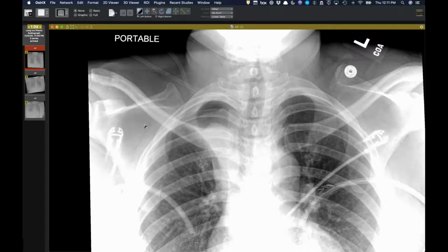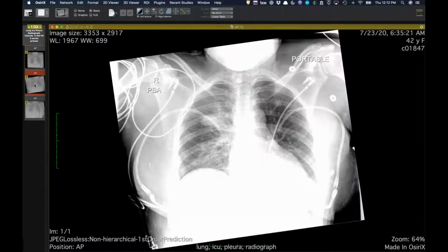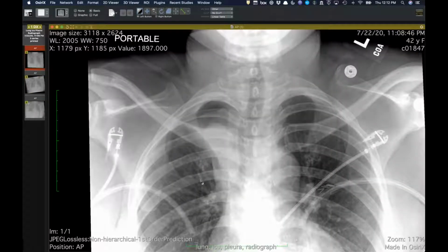Do you presume, Howard, that the patient had something like intraoperative secretions, or an aspiration episode? No history of aspiration. I think it's probably just secretions and plugging, because this next radiograph was just a few hours later, I think. Or maybe, let's see, which one was the next one? I guess it was the next day, the next morning, but they didn't do any intervention in between. Of course, it's most important not to place a chest tube, because we certainly have seen pleural injury from breast surgery in the past, although rare.